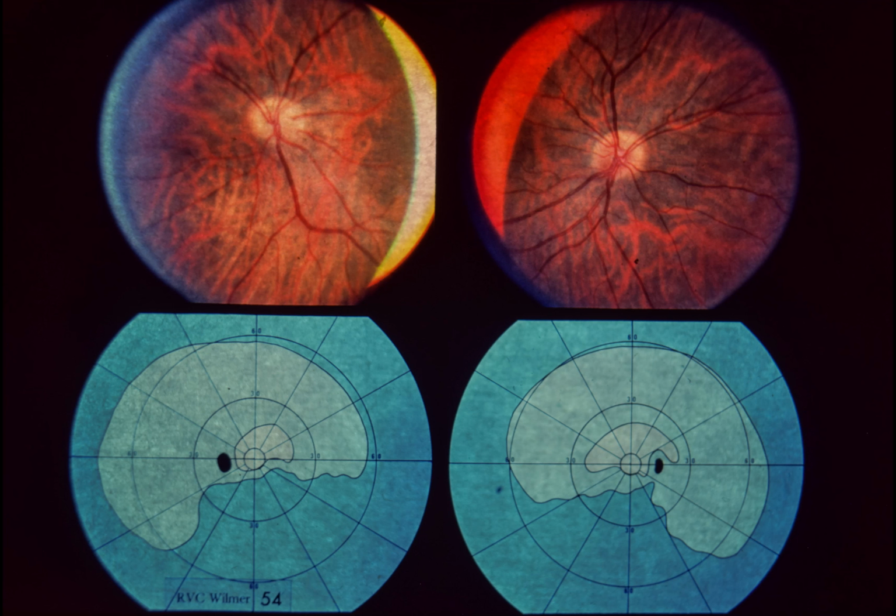Lower left and lower right. Both visual fields show inferior altitudinal defects. The patient's mother has diabetes mellitus, and the patient's birth weight was 9 pounds. Optic nerve hypoplasia has been reported as an isolated finding in children of diabetic mothers. All patients have had bilateral optic nerve hypoplasia, good visual acuity, and altitudinal visual field defects. The occurrence of this phenomenon suggests that maternal influence plays a role in some cases of optic nerve hypoplasia.